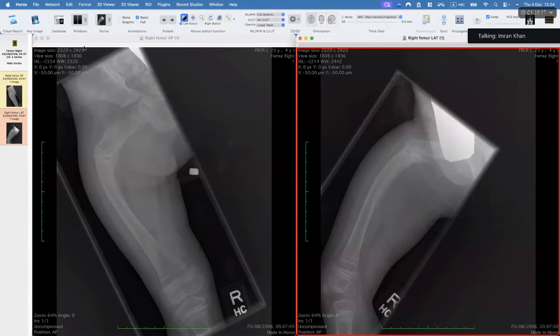Okay, here's a question for you. These dense metaphyseal bands, what could they be related to? So normally they can be a normal physiological finding as well. However, if the patient is on therapy for his underlying disease process, these can appear because of that. In rickets also, we can see dense metaphyseal bands. But in this patient, if the patient has a known diagnosis of osteogenesis imperfecta presenting with this bending deformity of the femur with fracture and these dense metaphyseal bands, it can be because of underlying ongoing therapy for his disease process.